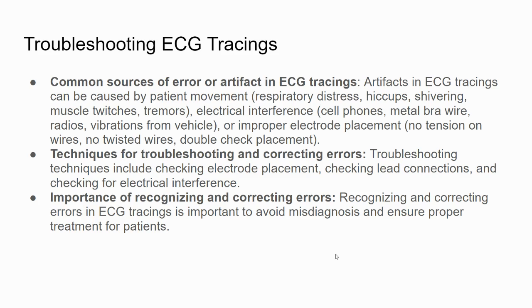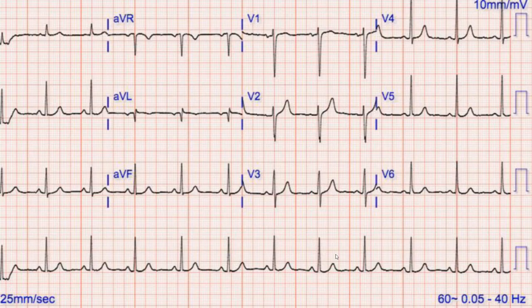And it's important to correct these errors, or to correct the artifact, to make sure that we don't have a misdiagnosis or just a lack of diagnosis because we have a non-diagnostic ECG.